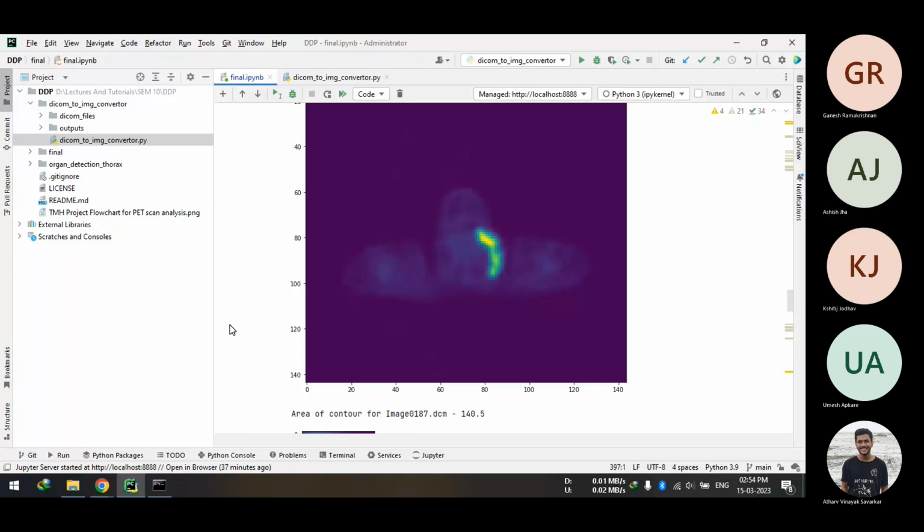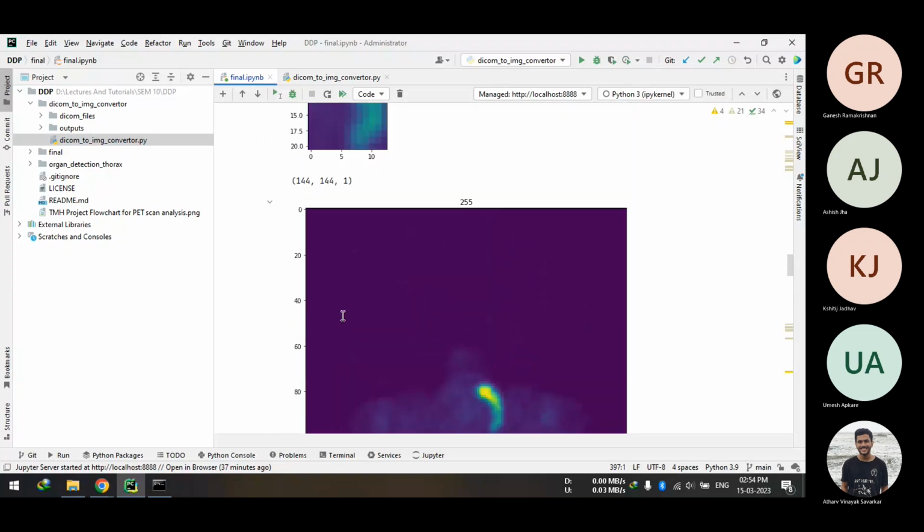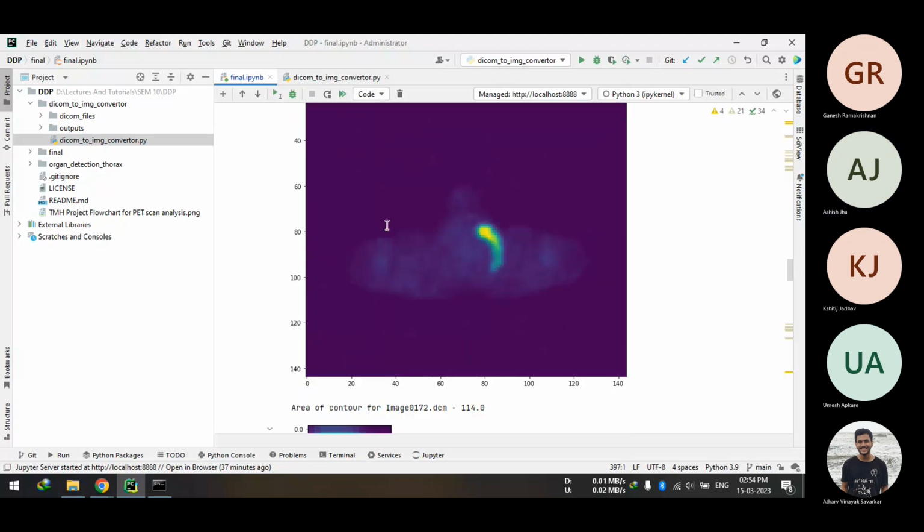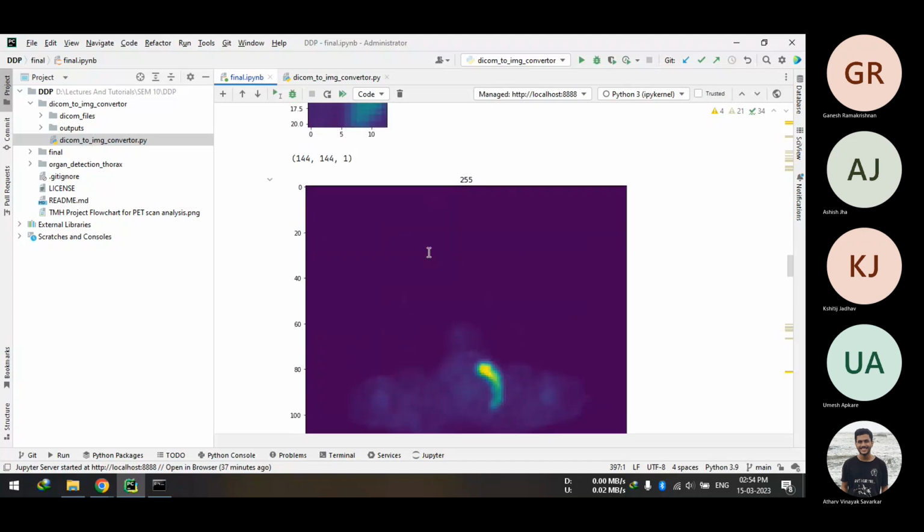Just a moment. Atharva, are you able to calculate the volume of the tumor? Yes. I am able to calculate the exact area of each of these contours, and add the areas. Also, I know how to calculate the thickness of each voxel.